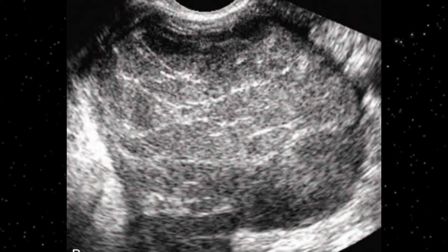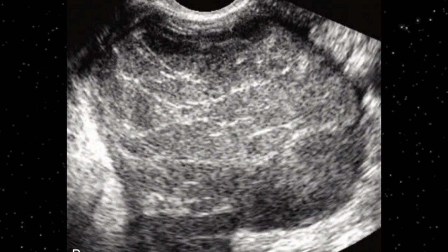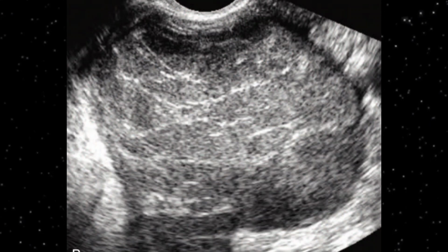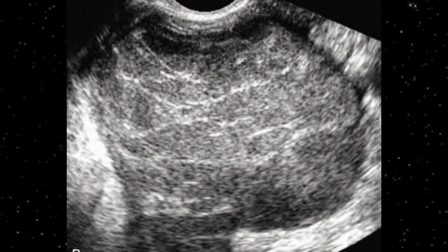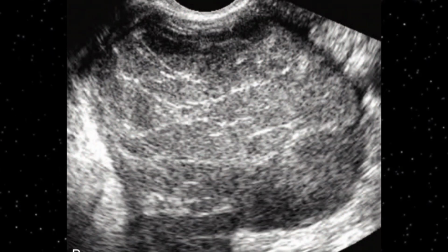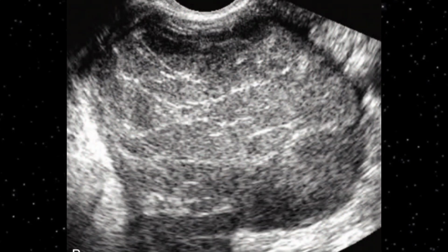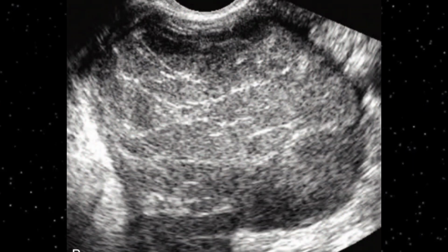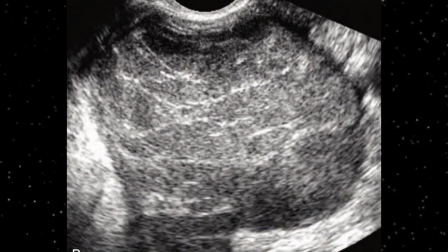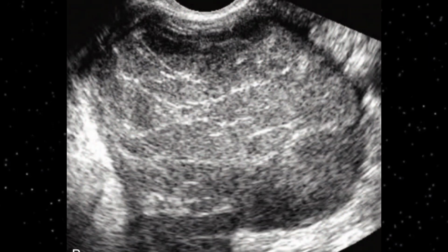This is germinoma, and this germinoma can also present in this fashion as well. So this is a highly malignant tumor, and as I mentioned, this is identical to the male testicular seminoma. Both are malignant tumors, both have a large malignant potential, and this is a germ cell tumor. So germ cell tumors comprise cystic teratoma, dysgerminoma, and yolk sac tumor.